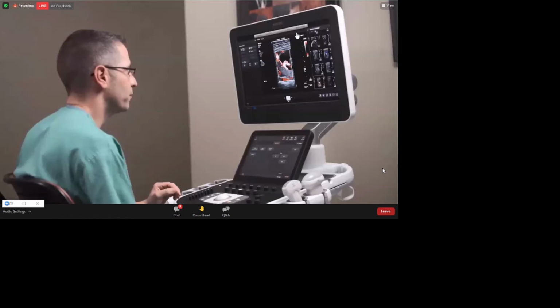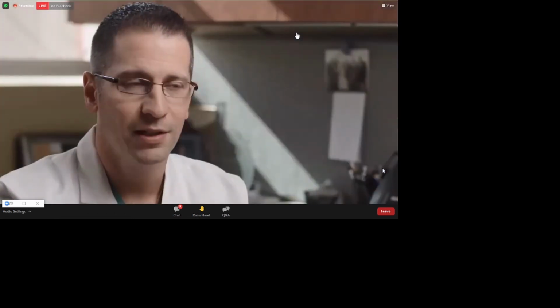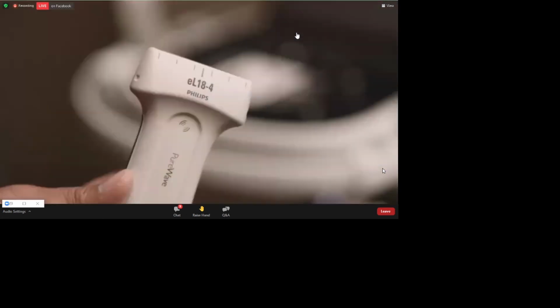This probe has a significant future in obstetrics. I think it has a significant future in maternal fetal medicine. When we look at areas where we might particularly want to use this probe in personal usage, it has helped me identify nuchal translucencies in difficult scenarios where previously I could not identify the nuchal translucency at all. In cardiac abnormalities, in heart cases when there are problems, delineating the underlying cardiac diagnosis is likely going to be much easier with this type of probe.